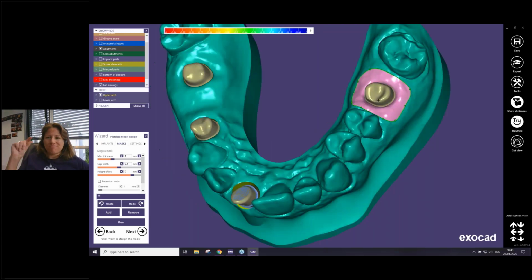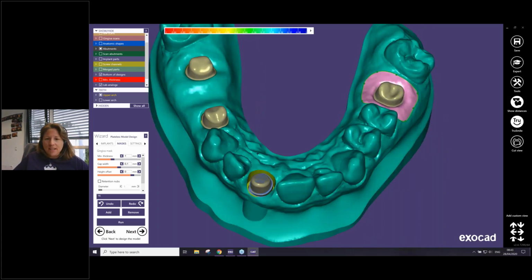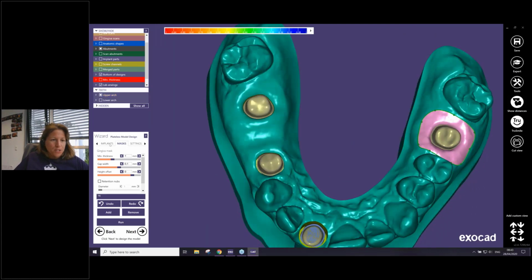If you'd like to change it, you can play a little bit with this height offset value, but it's not the same as in a plate model. Then you really have the plane, and you can control it or have more options. Over here, I will show you the difference between preconditioned and unconditioned.